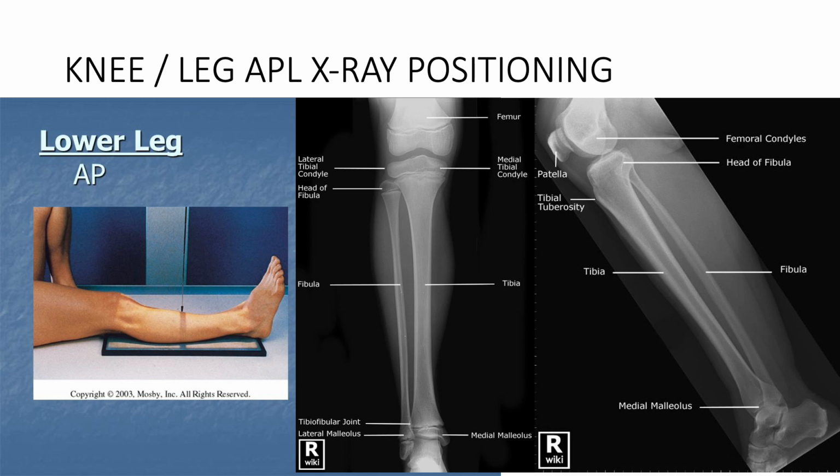And we go to the leg. So the same AP and lateral views, the same anatomical features, so the same parts you see in the gross anatomy study. So please go over the various parts, because they might be asked in your practicals.